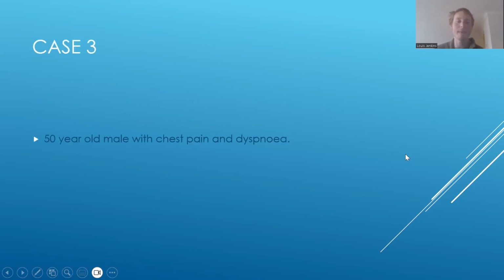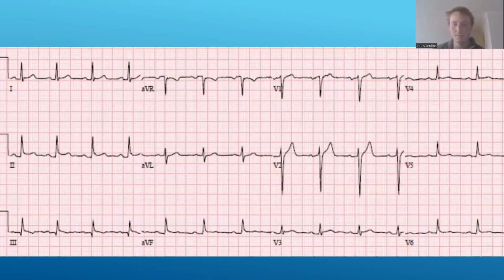Okay, so case 3. Moving on, we've got a 50-year-old male. He's got chest pain and dyspnea. Whoa, spoilers. I hope no one saw that. But if you did, I'm sorry. Anyway, here's your time to pause the video. Have a look. Tell me what you think. Actually, yeah, cool. All right.